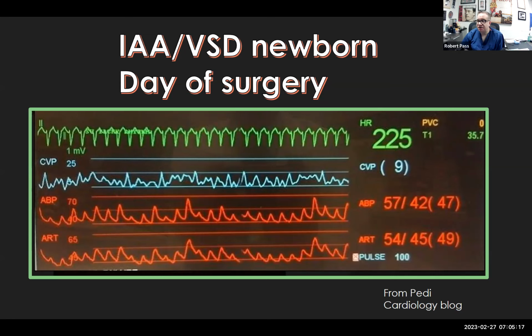So this tracing or this screenshot of the monitor was from the day of surgery. So let's say it was obtained at 8 p.m. and the operation was performed at 3 p.m., or finished at, or let's say 2 p.m. And we see here that the patient's temperature is 35.7 degrees. So what would you next do, Tarek? So you're at the bedside and they're asking for your expert consultation. So as you mentioned, Dr.